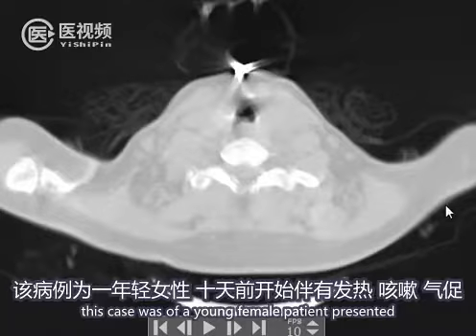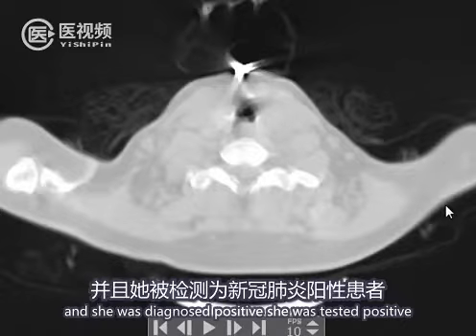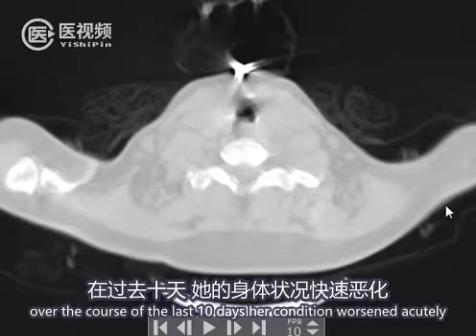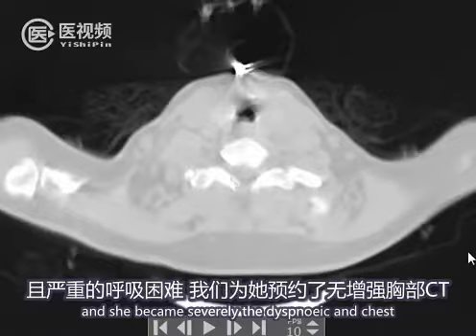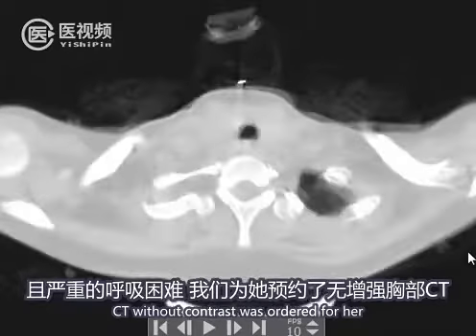This case was of a young female patient who presented about maybe 10 days ago with some fever, cough, shortness of breath, and she tested positive for the coronavirus, COVID-19. Over the course of the last 10 days, her condition worsened acutely, and she became severely dyspneic, and a chest CT without contrast was ordered for her.